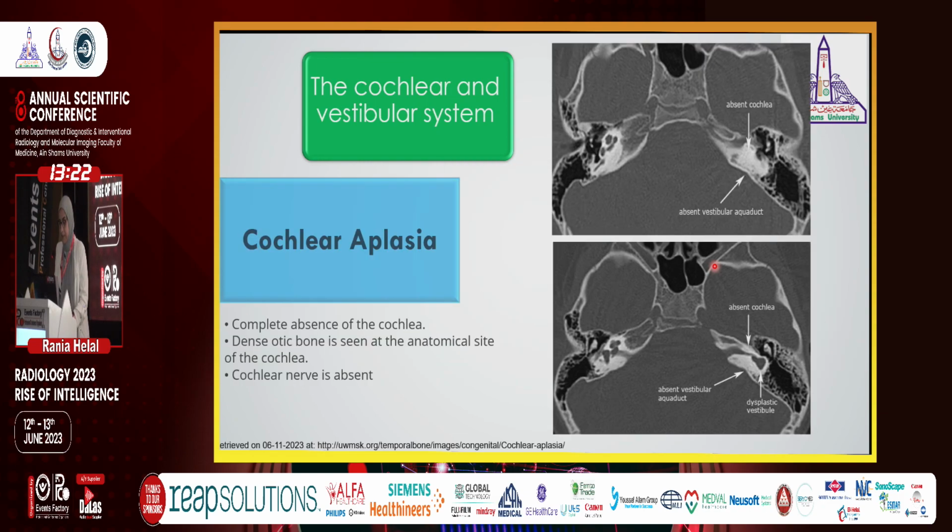Cochlear aplasia, complete absence of the cochlea. Dense otic capsule is seen at the anatomical site of the cochlea, and the cochlear nerve is also absent. As you can see here, here is the site of the cochlea. There is no cochlea, dense otic capsule, absent vestibular aqueduct, and dysplastic vestibule. In this type of deformity, this cochlear aplasia, we can have normal vestibule or dysplastic vestibule.